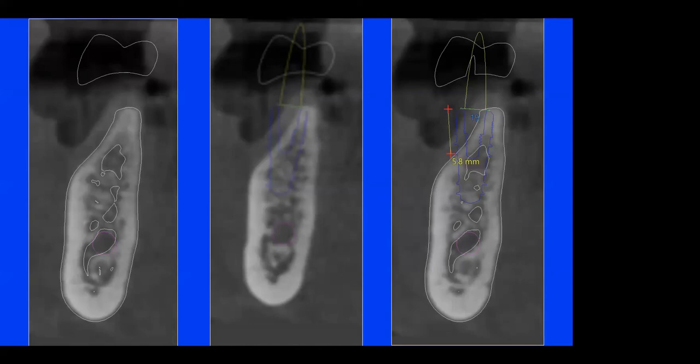So let's do some math here. We want at least a 5 millimeter implant in a molar area. If we look at how much ideal bone should be on the facial to preserve that facial plate, to preserve the soft tissue drape, we want 2 millimeters of bone on the facial. On the lingual, usually we can get away with a minimum of 1 millimeter. So if you do the math, 5 millimeter implant, 2 millimeters on the facial, 1 on the lingual, we need 8 millimeters of bone. If you go back to what I had measured, we had 2.1 millimeters.